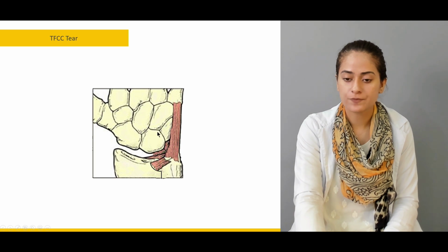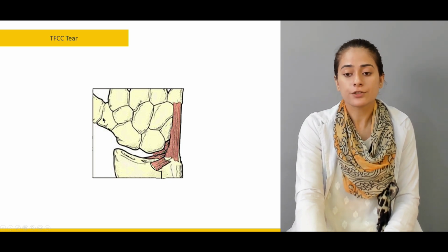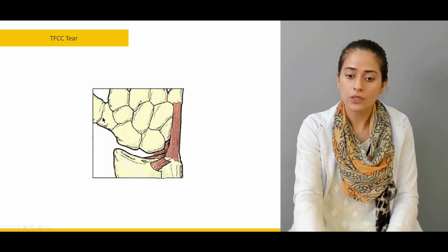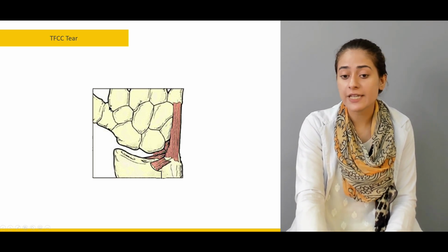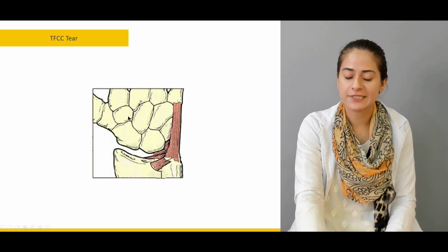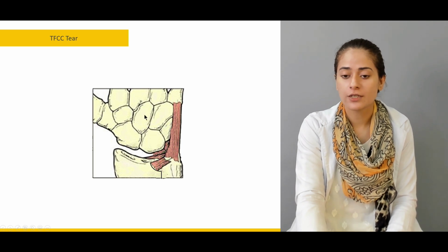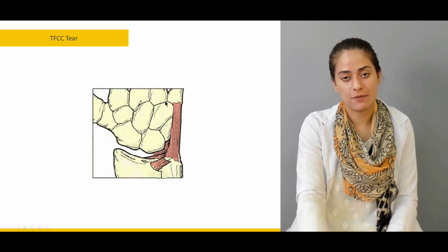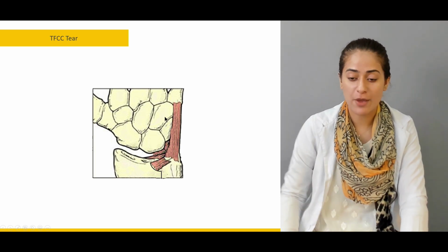So scaphoid, lunate, triquetrum, and pisiform is not visible here. Again, from lateral to medial, let's go. So this is trapezium, trapezoid, so TM before TZ, because M is obviously before Z. So trapezium, trapezoid, capitate, and hamate. Finally, we've got it. So I hope everybody has memorized this as well.